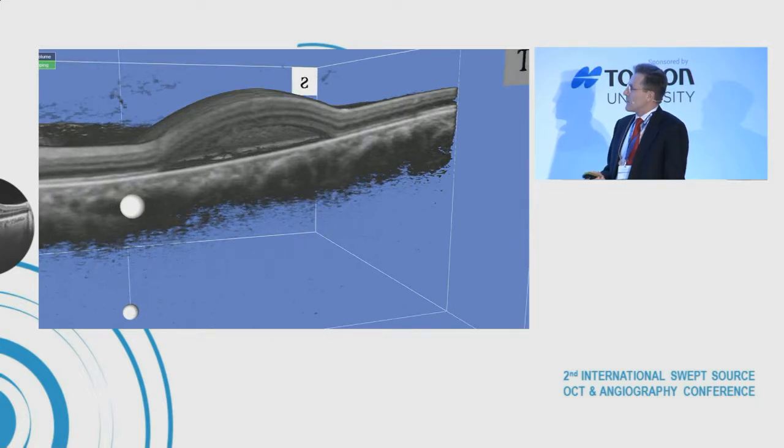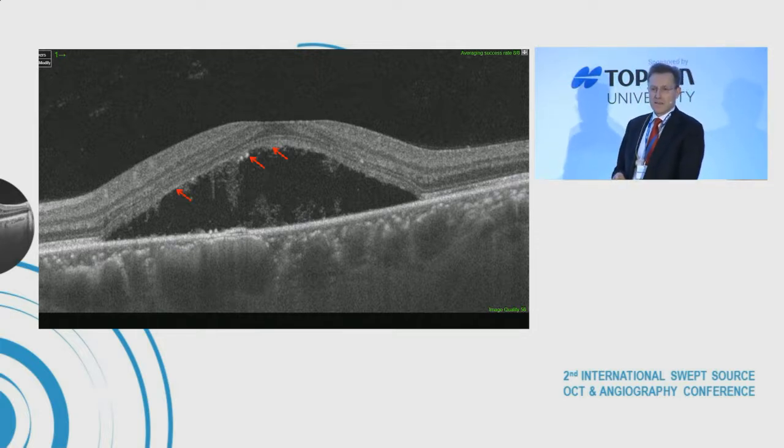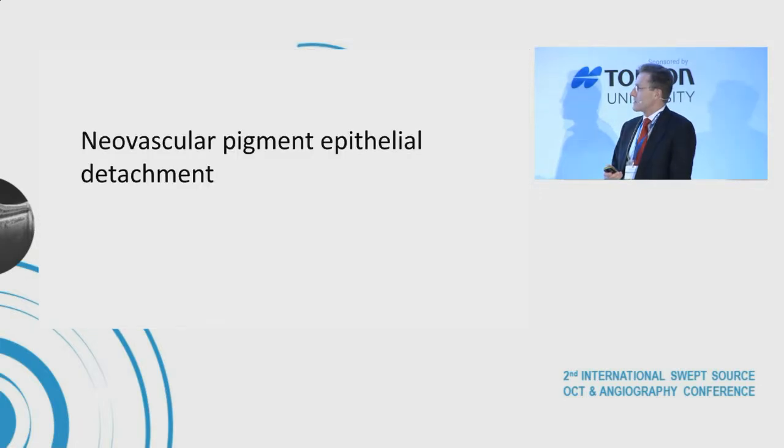Then we move on and summarize the features of the structural OCT, the B scan, and the 3D rendition is composed by lots of parallel B scans that are put together and stacked, and this is possible because the swept source is uniquely fast. And the way it was introduced at our institution in Copenhagen, we saw it merely as an OCT angiography instrument, but there's a lot more in it, and these scans are very fast and very, very convenient for visualizing and examining patients and their diseases.